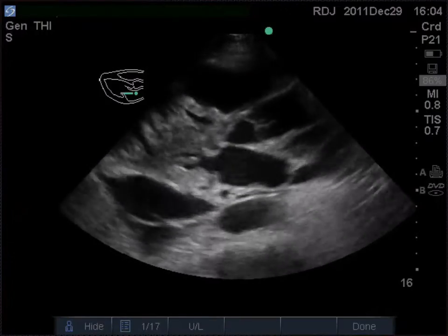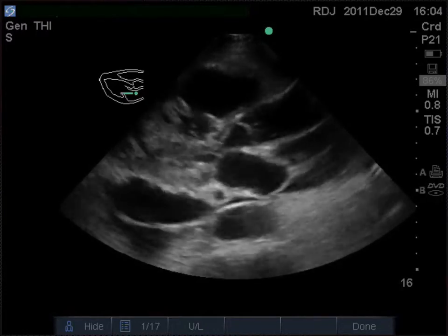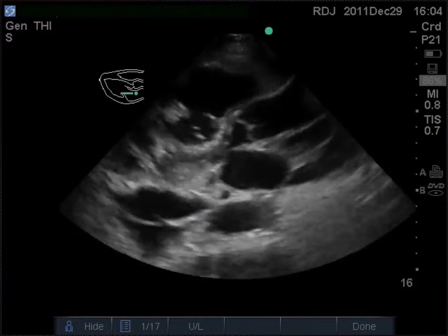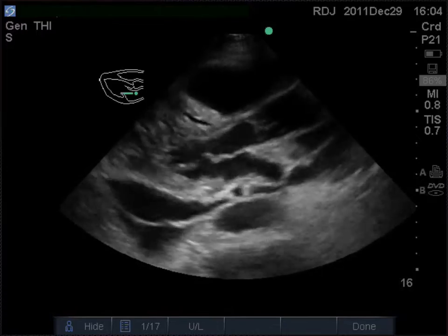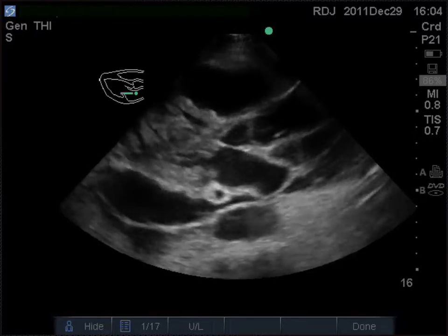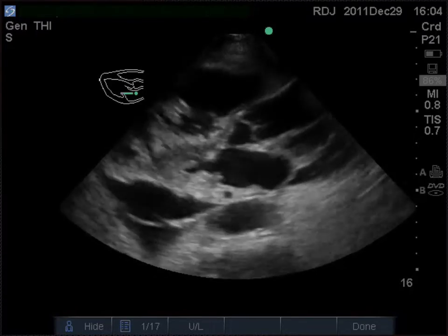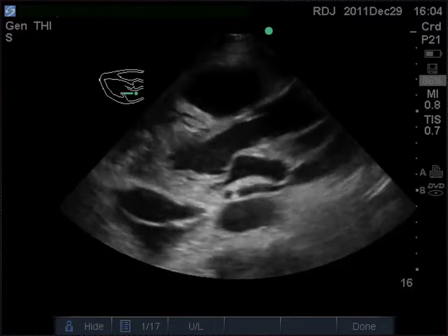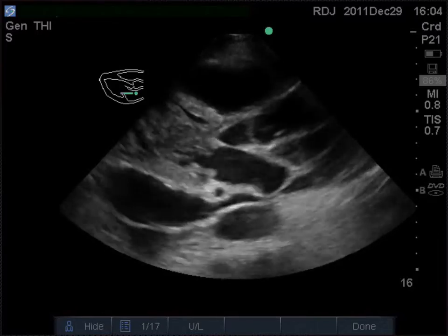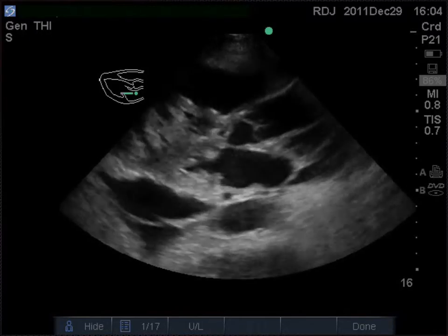Okay, so in this case, this is a very poorly patient, and this is a parasternal long axis. Now you can see that you can make out where the left atrium is, the mitral valve. The internal chamber of the left ventricle looks like it's quite collapsed and it's very narrow, and there's the aortic valve and aortic root in there with the right ventricular outflow tract on top. So it is the parasternal long axis view, but it does look very unusual because you've only seen normal ones before.